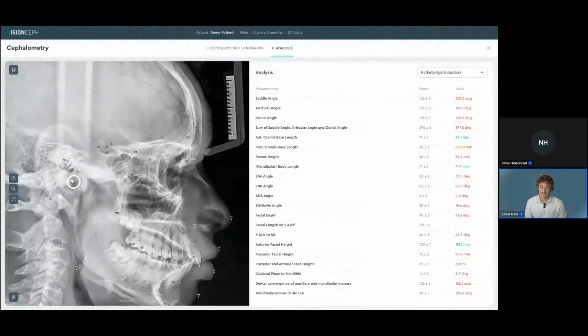Now let's see the skeletal diagnosis. This cephalometry was generated inside the platform. This is one of our latest updates. I won't bore you with loads of values, but we found a skeletal Class 2 tendency and bimaxillary protrusive positioning. When we look at the vertical pattern, we see that it's consistent with a hypodivergent brachyfacial patient, which clinically matches the deep bite tendency that we will manage through staging and finishing.